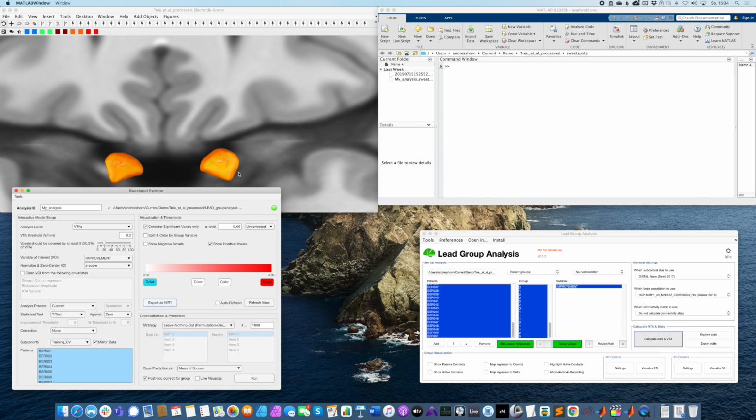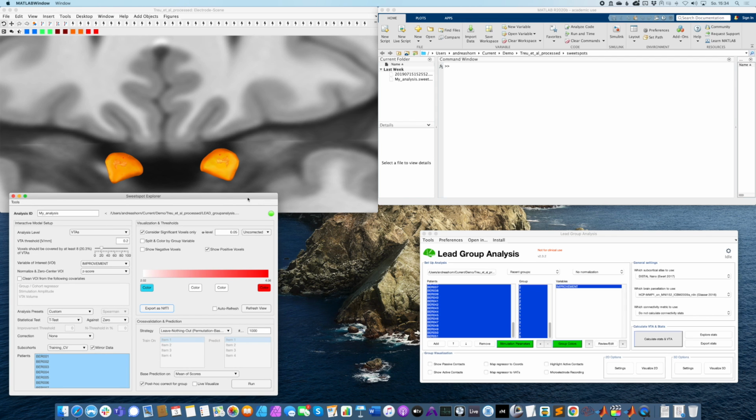Again, this is not really significant now because we have performed a million t-tests, and of course there will always be some positive values in there, right? So the false positive rate is in this case at least 0.05. So we will definitely get alpha error accumulation. But maybe to recap, we have gone through quite a lot now.